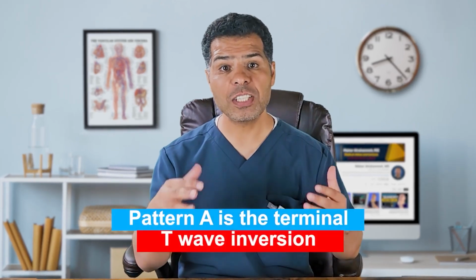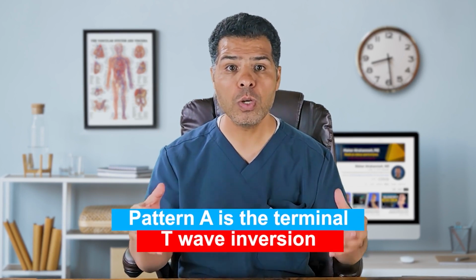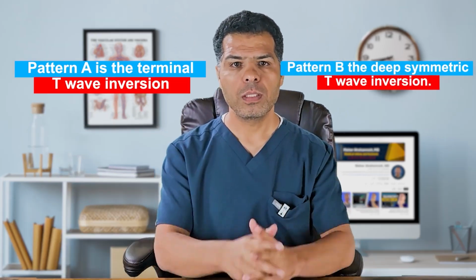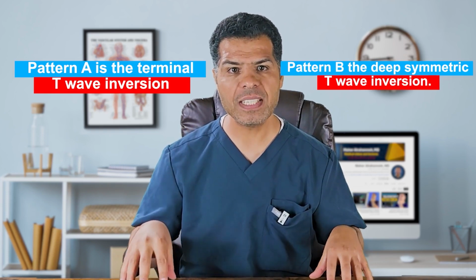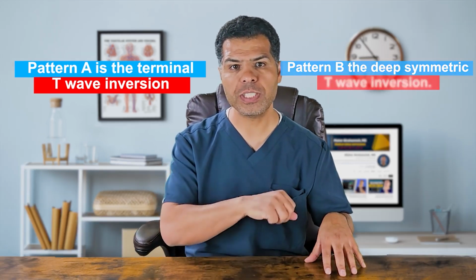Pattern A is the terminal T wave inversion we described earlier that is typically seen soon after reperfusion, which almost always evolves into type B, the Wellens, the deep symmetric T wave inversions. So always think of Wellens when you see T wave inversions in somebody who presented with chest pain that has resolved and the EKG obtained while chest pain free.